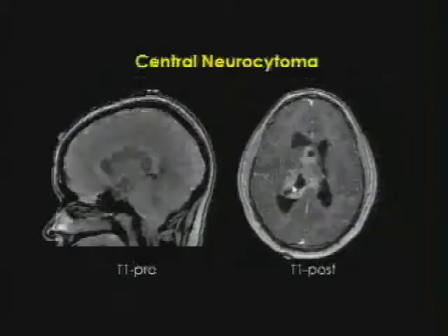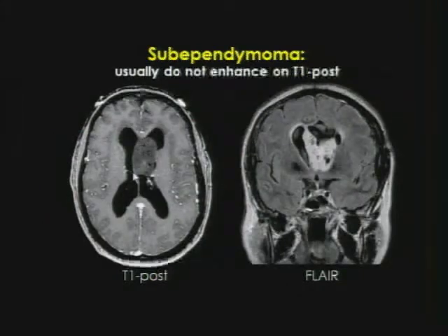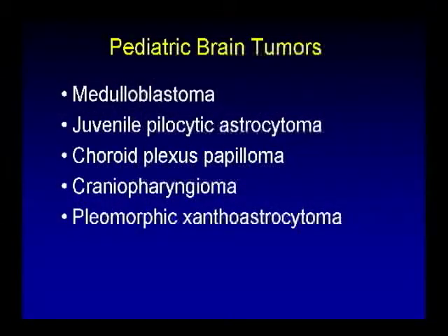Not true, because in central neurocytoma, these are incredibly vascular tumors. We've had a recent case of a patient bleeding out 2 to 3 liters of blood because these are incredibly hemorrhagic. So surgeons need to know before they go in whether it's subependymoma or central neurocytoma, and the biggest clue will be post-GAT T1 imaging, and if you're doing perfusion MRI at your centers, that will be another very helpful test to do. Intraventricular mass that has attachment to the septum, think about central neurocytoma and subependymoma.